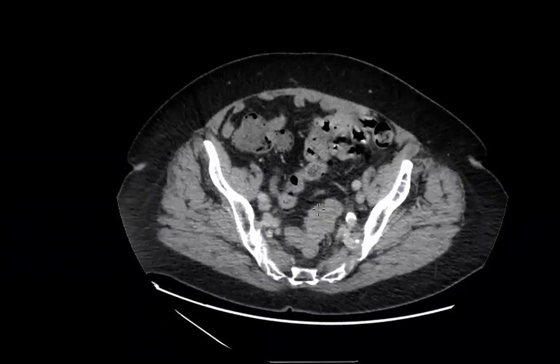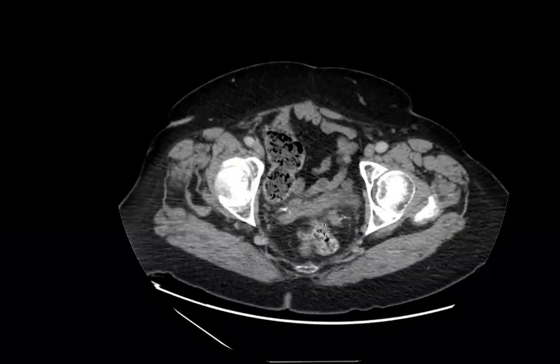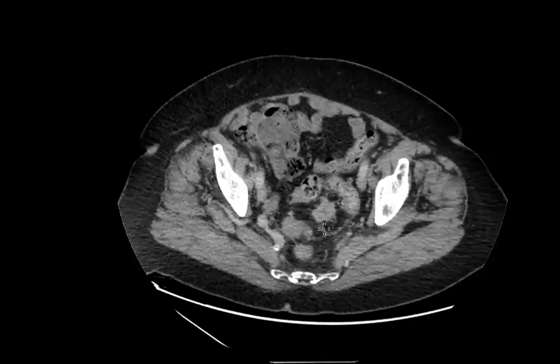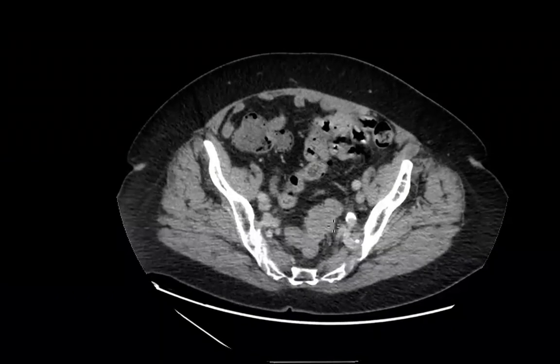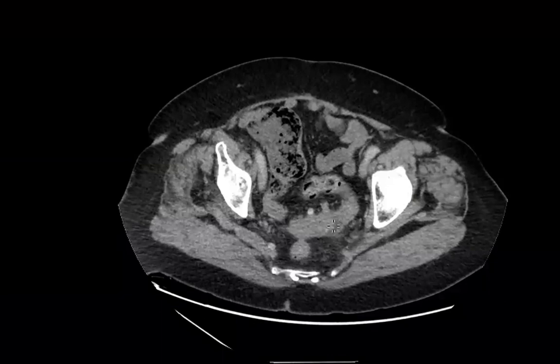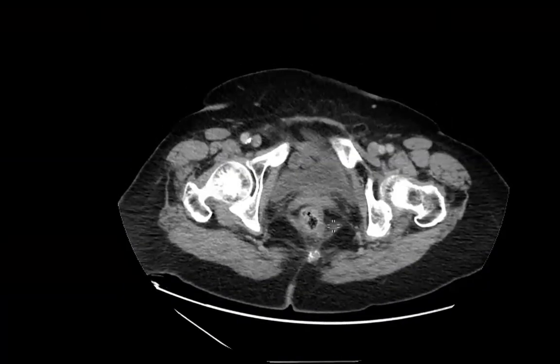It is a very dangerous area because it looks like a bowel. It's lobulated. So I'm pretty sure if I showed you this, you could have missed this one as well. So don't be overconfident that you wouldn't miss a big lesion like this, because this lesion actually was missed. And the only way we found out is it came to the MDT, and I was doing the MDT. That's why we stress the importance of the MDT, but also the importance of you checking the review areas so you don't miss a significant pathology like this.